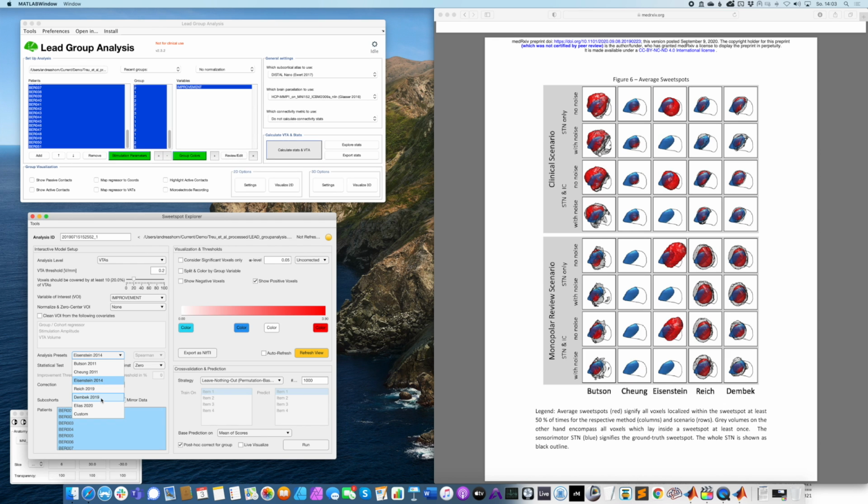And then the Dembeck paper and the Elias papers both basically used permutation statistics afterwards as well, right? So what we're capturing here is just the very rough and main idea, and we then have a cross-validation and prediction part of the tool that can be used to draw inferences based on the models we find.